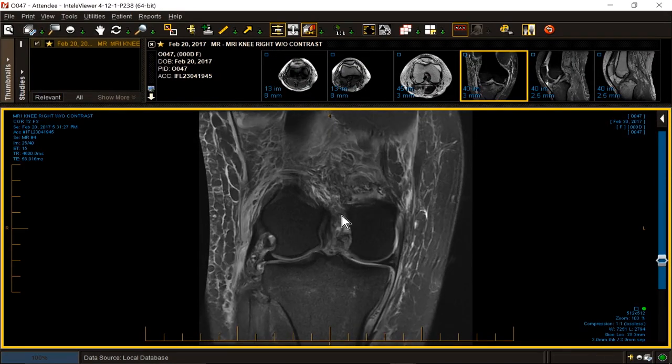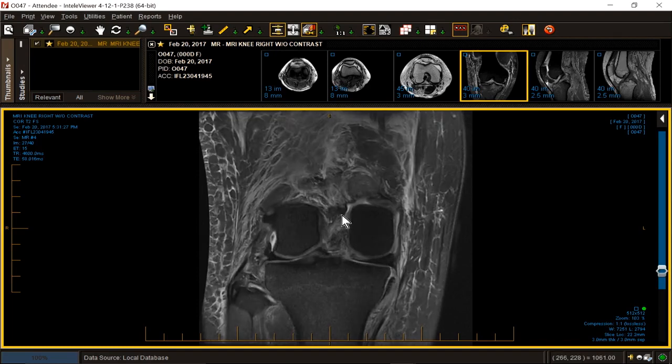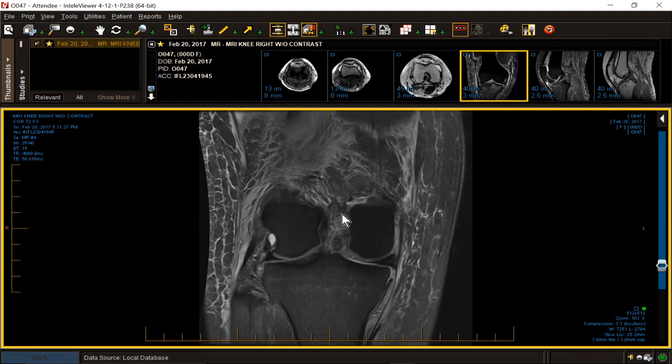Now, one of the nastier injuries that goes unrecognized is a PCL tear with a posteromedial or lateral corner tear, because PCLs are not repaired. But a PCL with a corner injury, repaired. So you better not miss that.